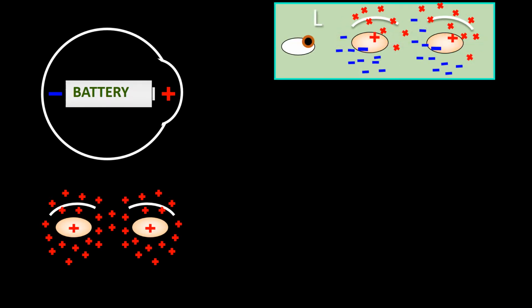When looking up and to the left, the positivity goes up and to the left, thus creating an oblique demarcation between the fields in the right eye and in the left eye.